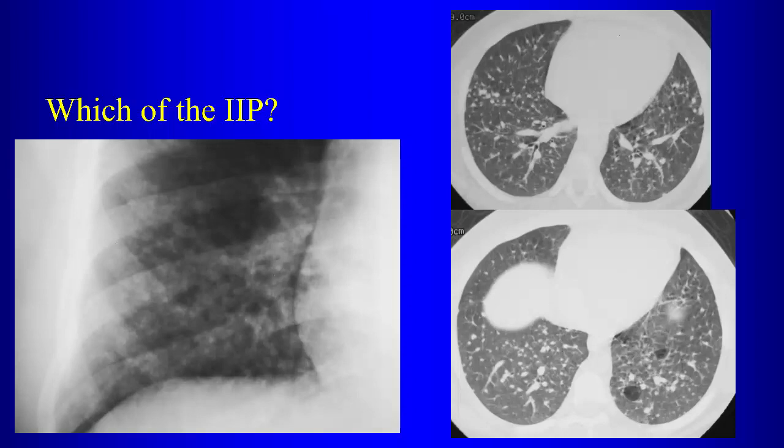In the lower lobe? Right lower lobe? These guys? On the top one? Yeah, these are all blood vessels. Okay. Pulmonary cysts. Cysts, right. So look at these. You have these air-filled thin-walled lesions. You have air-filled cystic lesions.